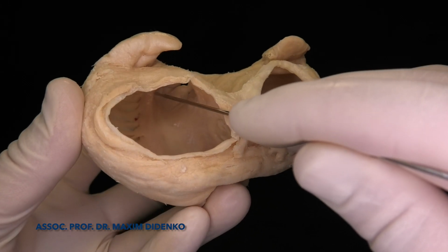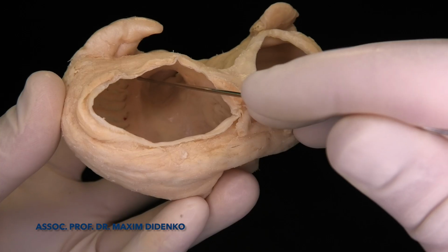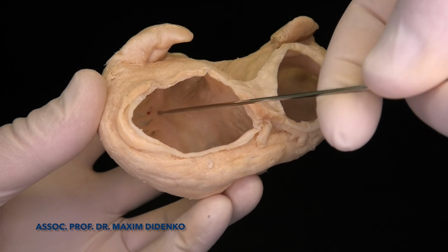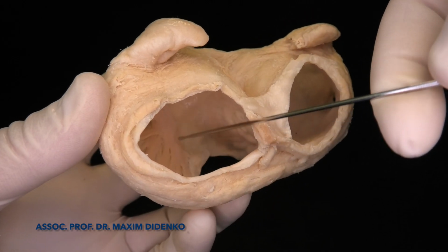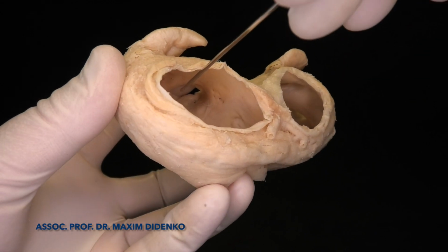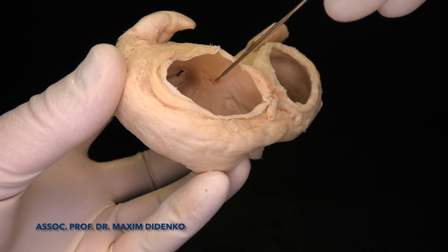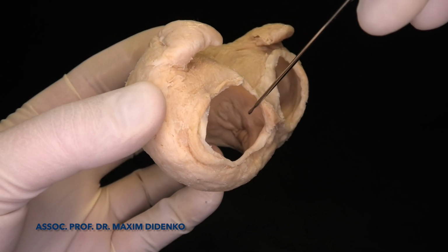So this is again crista terminalis, where the cells is located parallel to each other, and they will propagate impulse a little bit faster, about 20% faster along these fibers here. So we also know this so-called Wenckebach pathway and bundle, which going towards to the AV node.